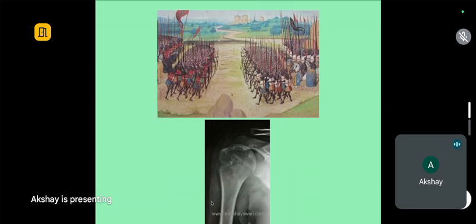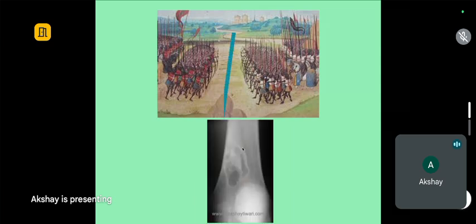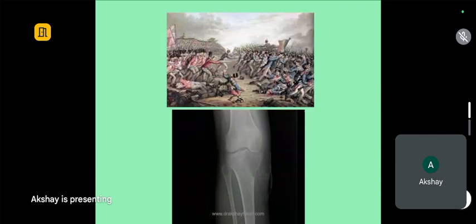So this is also a benign, but a benign active disease. The earlier one was a benign inactive disease, right? The third is again a benign disease. You can still see the demarcation between the two armies, but the attacking army has kind of started attacking. The demarcation is blurred, right?